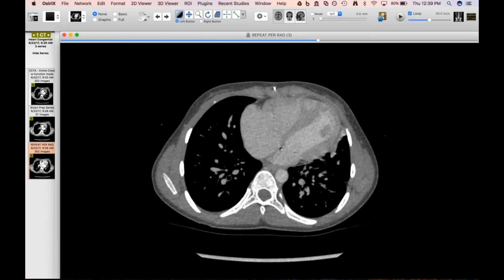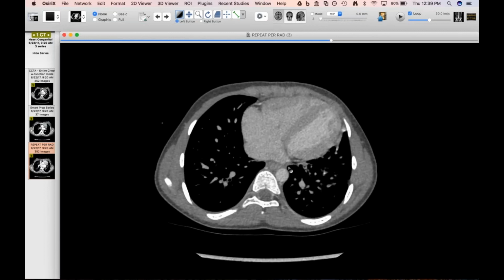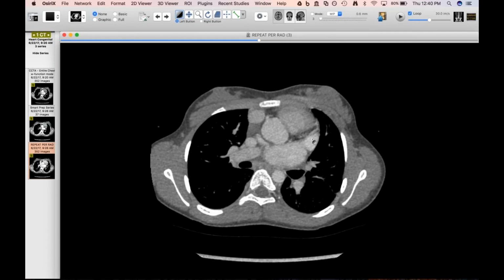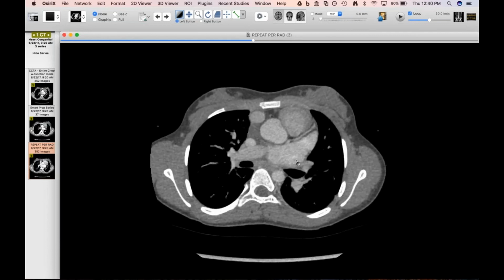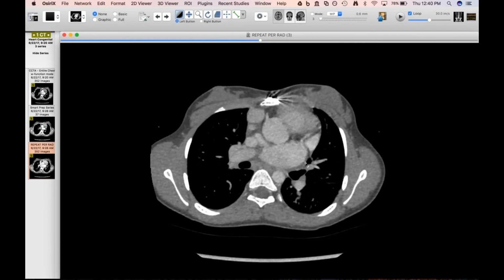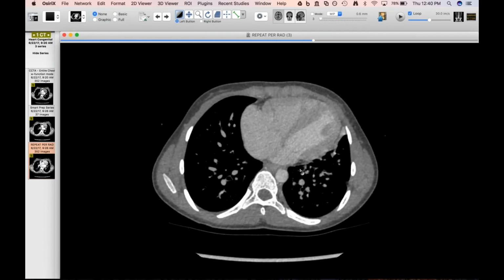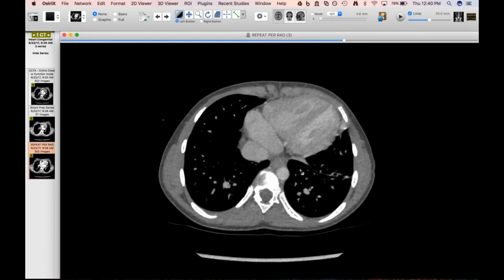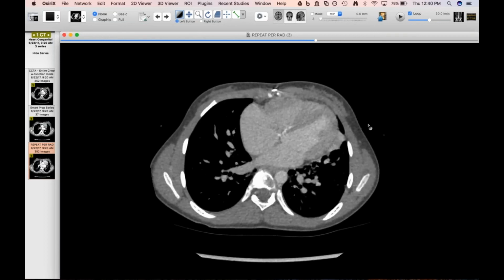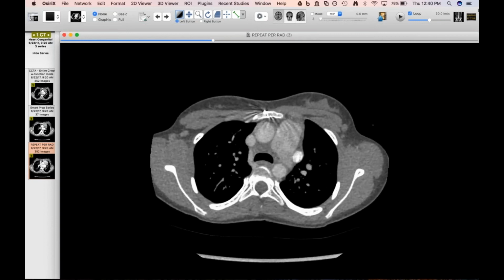And so, of course, she doesn't really have much of a coronary sinus or any real coronary sinus here, maybe a tiny little bit just draining the veins, which is really interesting too, because you can have left SVCs that communicate with the left atrium via unroofed coronary sinuses, but this is just going straight into the roof of the left atrium, and not into a coronary sinus. So I thought this was a fascinating case, and the fact that I've seen another one identical to this. So just remember, when you see a left SVC, always look and make sure it's draining into the coronary sinus as it should.